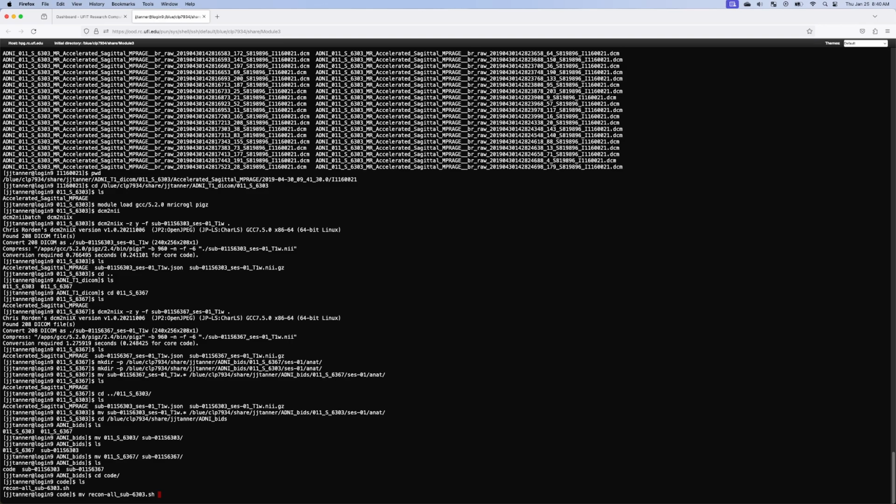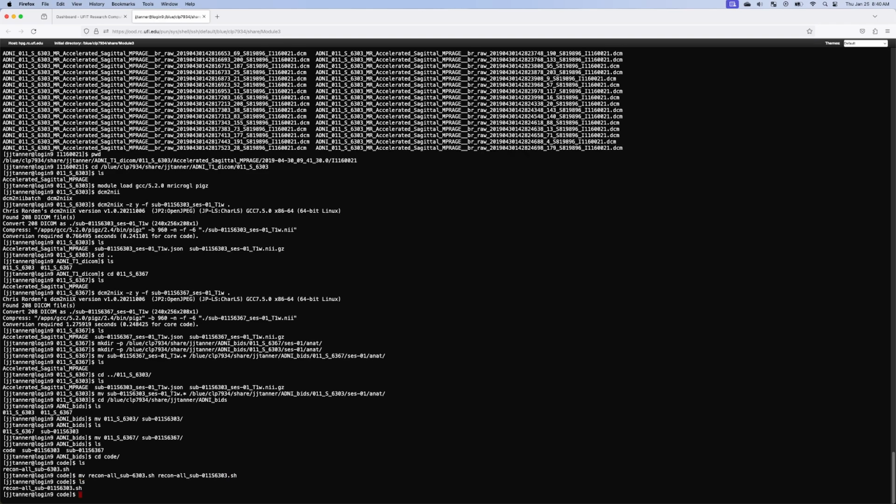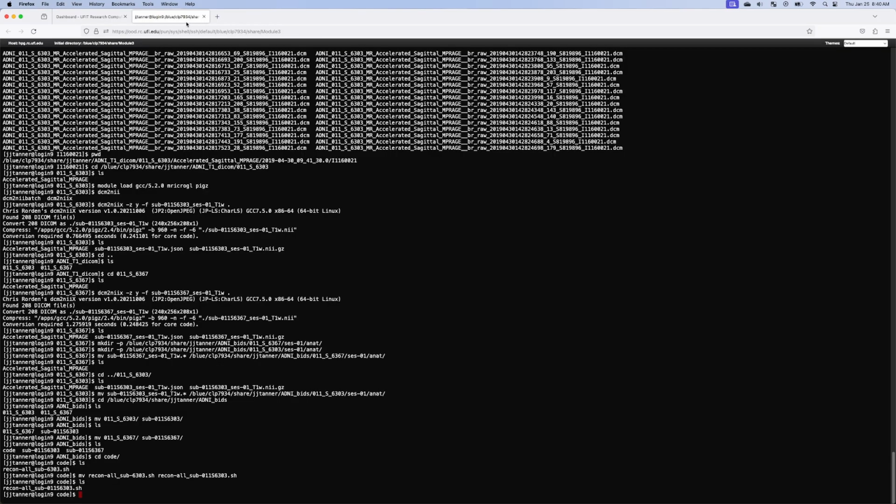So I'm going to move that, and I'm going to hit tab again, but I want to rename it. It needs to be the 011S6303, and then this works. So the command line works. The renaming and moving this way doesn't always work. And so there's that file.